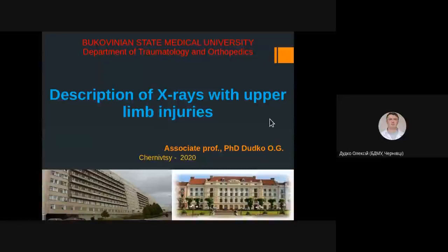Hello, today we're going to discuss with you how to describe X-rays with injuries of upper extremity. So this is an important part of diagnostics, and if we're talking about X-rays, we should have in mind some rules for how these X-rays should be done.